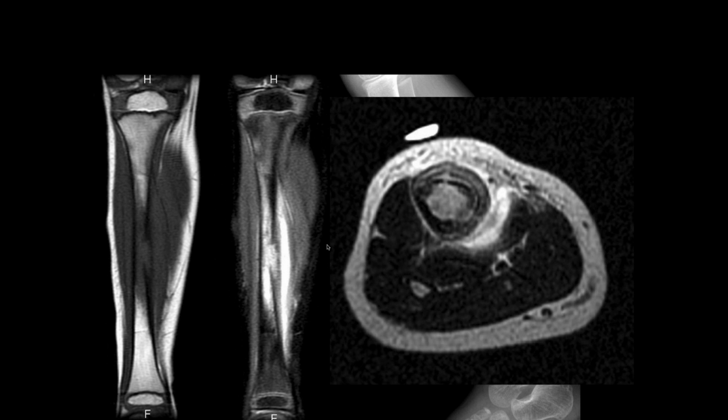Okay. That periosteum is really swollen, isn't it, John? Yes, it is. Up and down that tibia. Yeah. So that's more than just a stress situation. Right. So eosinophilic granuloma is one you always have to consider. This is more abnormality than we typically see, but eosinophilic granuloma can have a lot. And then Ewing's, and then another one is fibrous dysplasia, osteofibrous dysplasia, and what's the third one in that group?